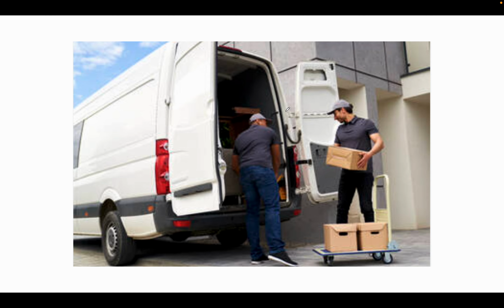Here's an analogy for anyone who finds analogies useful. We have this person here who's passing boxes to this person here at, let's say, a specific rate. This is the sinoatrial node, this is the atrioventricular node, and this van is the ventricles.